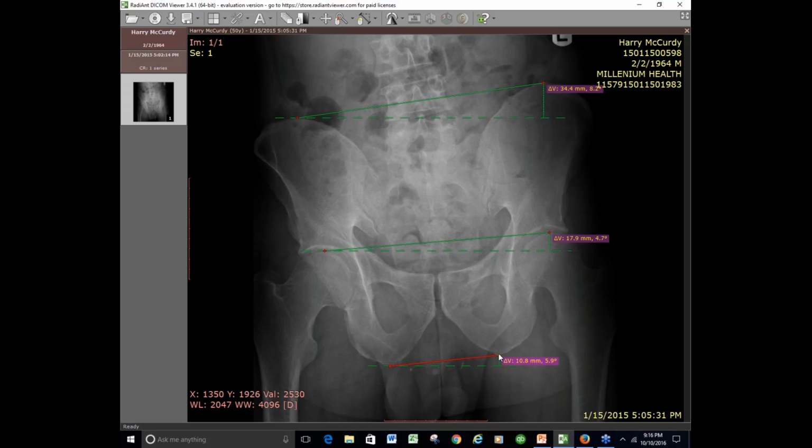So here's where you got to do a little bit of math. Presently, this is 10.8 millimeters. I should probably write that down because I will forget. So 10.8 millimeters on the bottom. I need to get it high enough that it will raise this 8.2 degrees. I'm sorry, we'll raise this 8.2 degrees because the difference is the smaller side is over here, right? So what kind of lift will I need to do that?